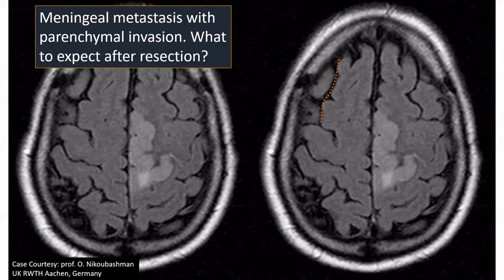Let's get started. Here we have the superior frontal sulcus, which forms an intersection with the precentral sulcus. Then self-evidently, this has to be the central sulcus, and this is the postcentral sulcus. We've become pretty good at this, would you say? So then this is the intraparietal sulcus, which often transects the postcentral sulcus. Now we can recognize the various gyri. Sulcal anatomy is very self-evident.